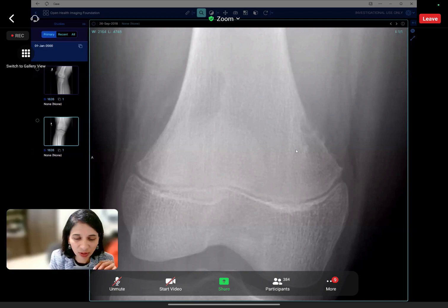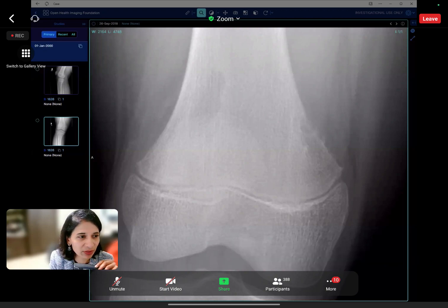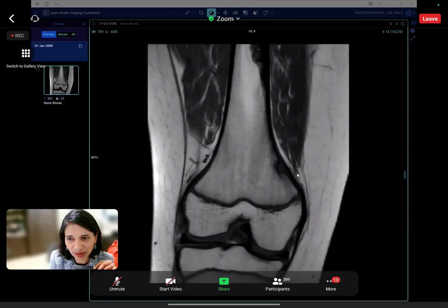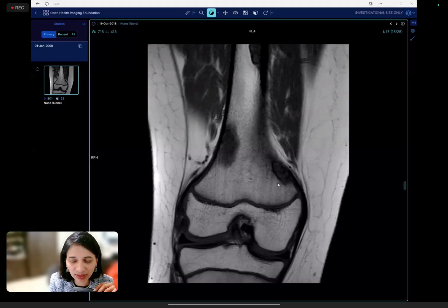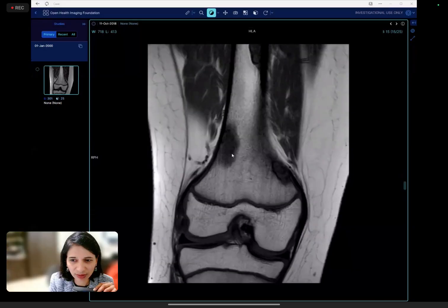And if they give you MR, don't be put off thinking, oh my God, I've seen one more lesion that I didn't see, because that lesion was not included in the plain film. And with MR, the main principle is that they all are well defined, they're all cortically based. Sometimes when the MR is given, candidates think, oh, I must be wrong, that's why they're giving MR. No, we are showing the MR just to confirm what you thought on the plain film. If you thought it is non-ossifying fibroma on the plain film, we're just giving you the MR to confirm that.